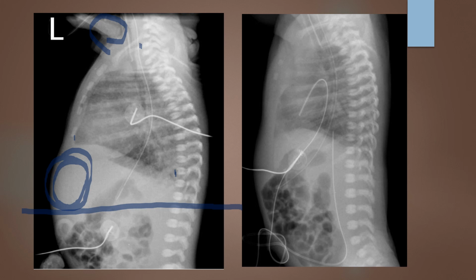So if we go on to further evaluate, we're looking for posterior rib superimposition, and you can see here are the vertebral bodies, and you see a rib coming there, a rib coming here, and we have perfect superimposition most of the way up. This little baby has something kind of interesting in the spine there, if you see. It might have something called a hemivertebra. So we have that good superimposition.